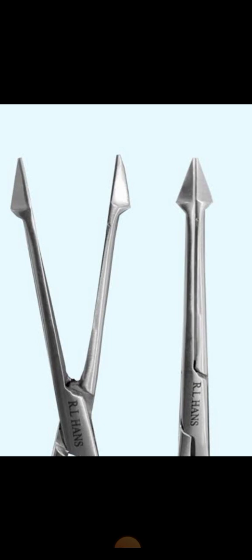This forceps is mainly used to search out the pus through the crypts of the tonsil, and it is also used for evacuating the pus. In this case, an intraoral incision is given either under general anesthesia or no anesthesia, and we make the child sit in an upright position because in the case of drainage of abscess, there is a risk of aspiration, so we do not do this procedure by letting the child lie down in a supine position. We have to make the child sit upright in this case.